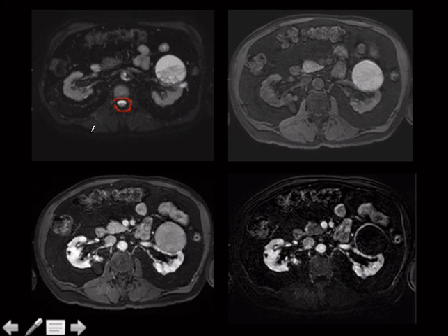And then here's another trick that I use for kidneys. This perinephric sweat that we see a lot here. Pretty much everybody always has that. So even if they coned in right down on the kidney and you could see nothing else, you can tell that's a T2 because you can see a little bit of that sweat, as opposed to this guy over here, which is a T1, which you can't really see that sweat on.